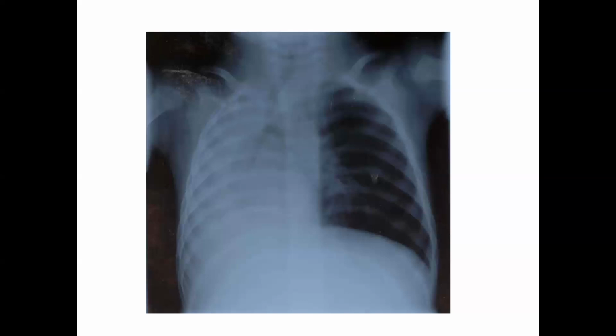With digital imaging these days, you used to take the actual film and put it up on the X-ray box and look at it, and there wasn't a whole lot to be done with changing the overall contrast. But with digital films, you can change the contrast a bit, depending upon what X-ray viewing software the facility you're working in is utilizing. So those are some things to think about.